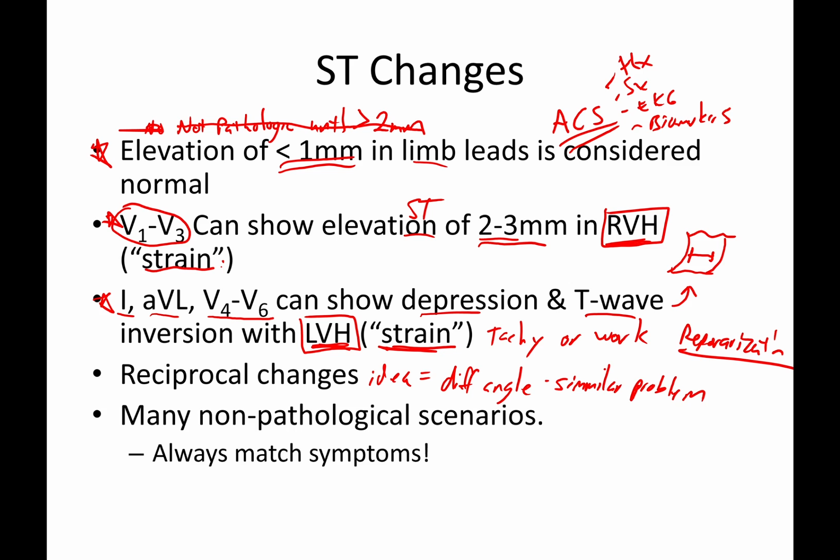We'll spend quite a bit of time on that as we go forward. The hint I will give you is the ST depression with T-wave inversion looks similar to a reciprocal change, and that's why we're mentioning it here.